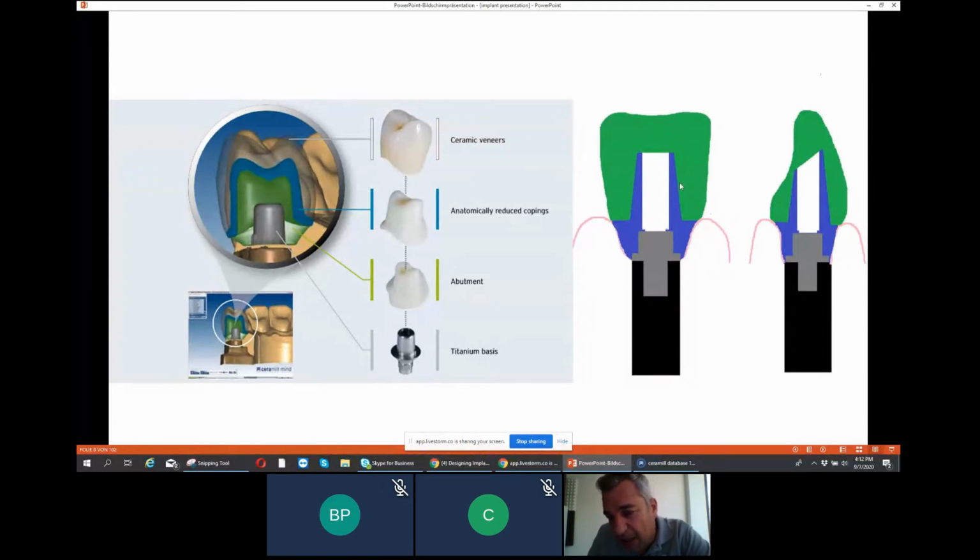Here I created a picture for all these types. We have implant, titanium connection, titanium base, abutment plus crown. If you can see it here, the titanium base is one part, an internal connection that fits inside the implant. We make over it abutment plus crown or screw retained restoration. This is from both sides.